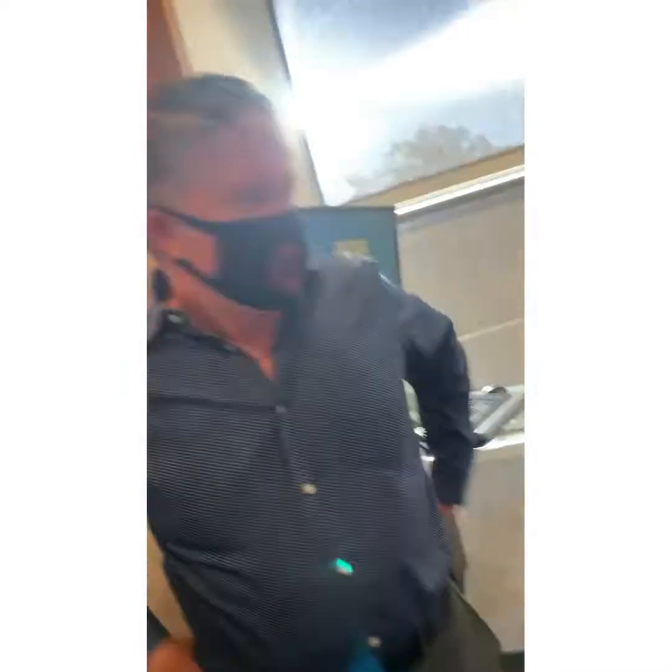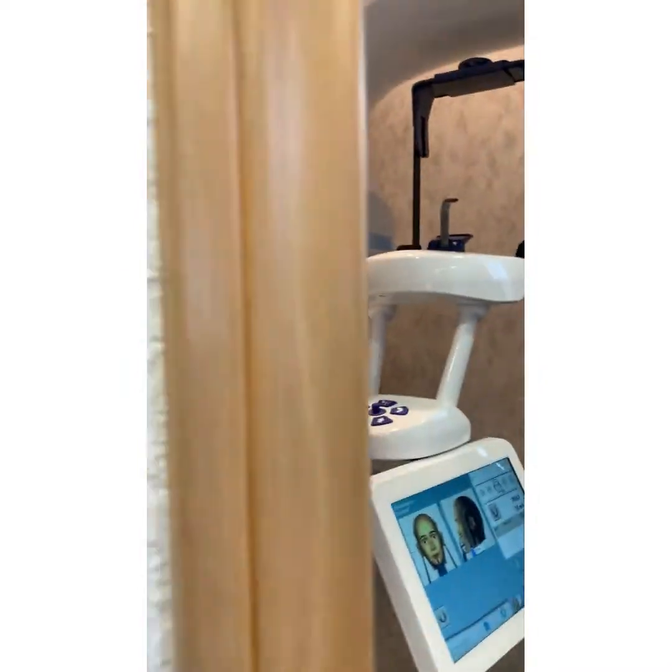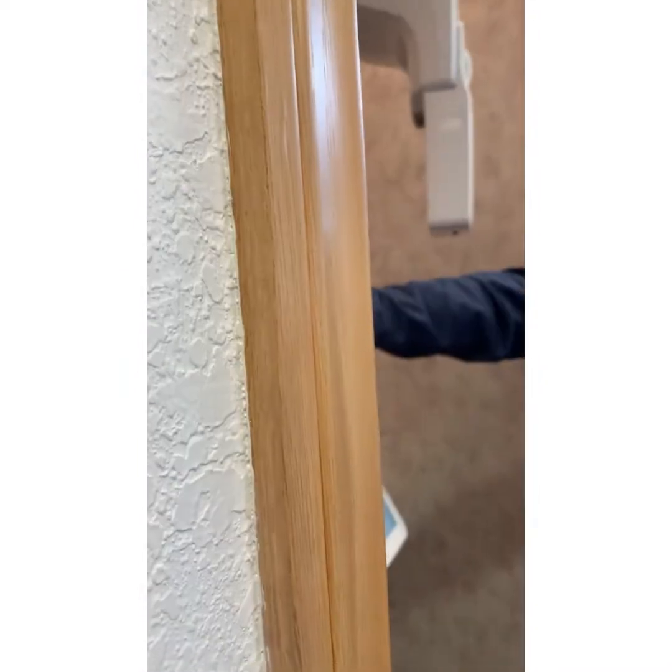So, are we ready to go to 3D? That was 2D. When do we learn Romexis? We're going to do that right now. What button brings it up and down for me? Have Robin make you a copy. I thought you brought a copy in here.